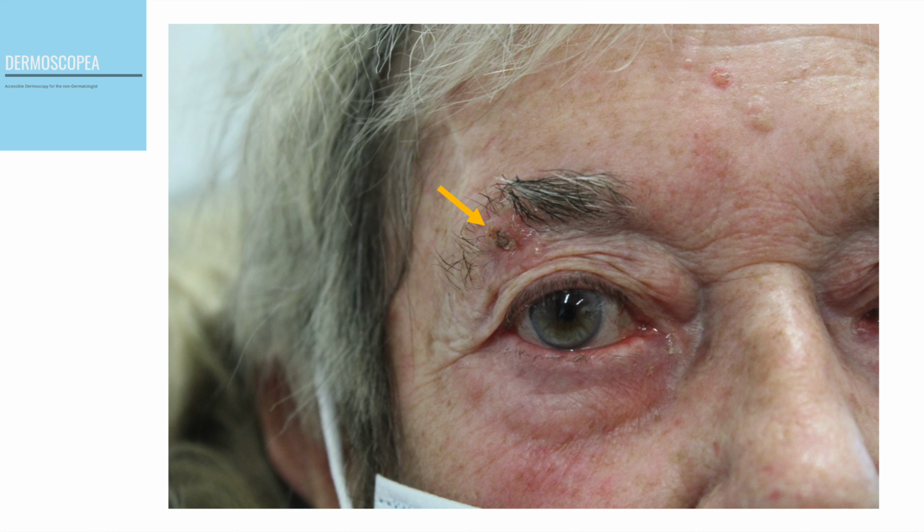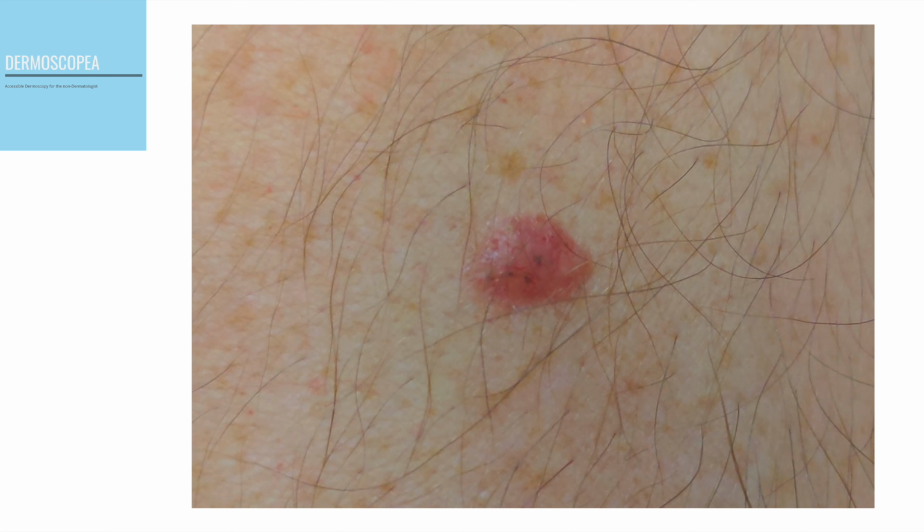This is another example of a basal cell carcinoma, or BCCs. Here we see another common feature of BCCs, ulceration, as these tumors tend to be very friable. And another BCC. Notice the small dots of pigment which are just visible to the naked eye.